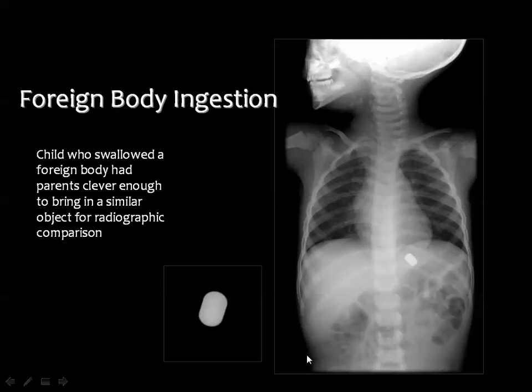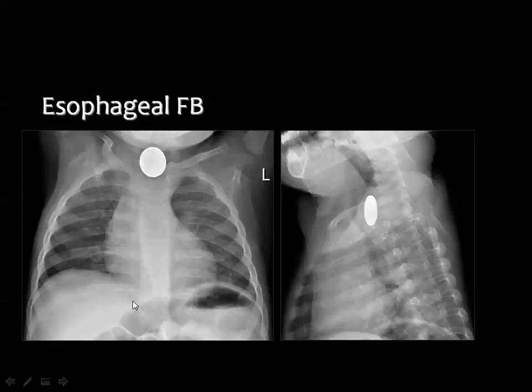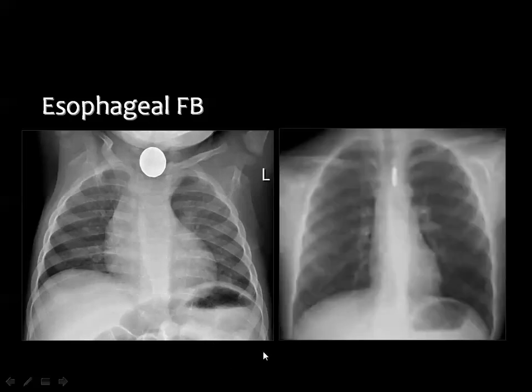And foreign bodies are commonly seen in children, either in the GI or in the respiratory tract. And if the foreign body is radio-opaque, you can see it on the plain film. And if you see a coin like this in the frontal X-ray en face, this indicates that this coin is present in the esophagus, because coins in the trachea are seen by the lateral side of the coin, but the coin in the esophagus will be seen en face like this.